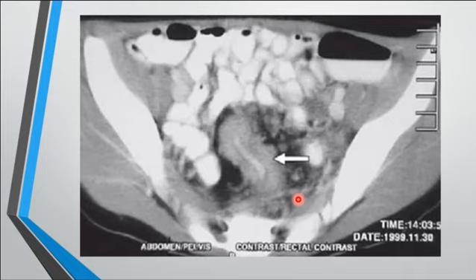If you do a barium enema for this patient, what would you see? The sign. No, apple core. There will be an apple core lesion, indicating colonic adenocarcinoma: circumferential wall thickening, narrow lumen with adjacent lymph nodes. If you look carefully, there might be some stranding of the adjacent fat planes, indicating a colonic adenocarcinoma. This is an apple core lesion.